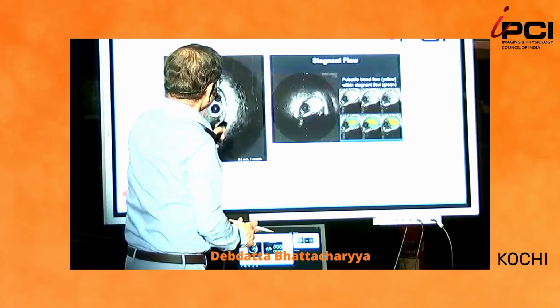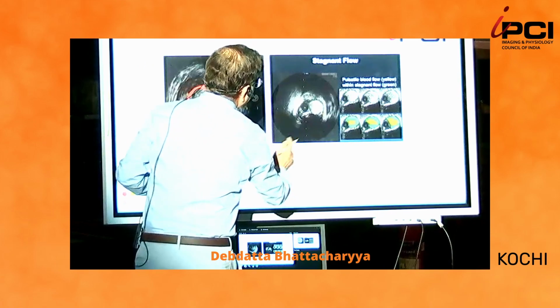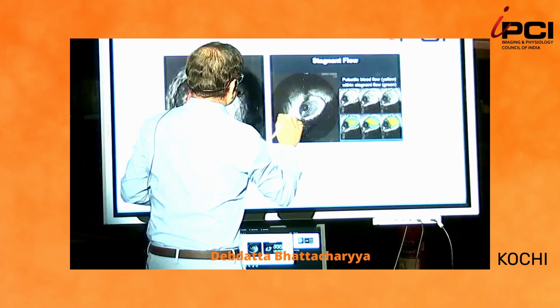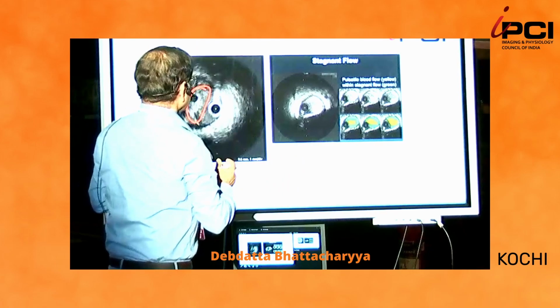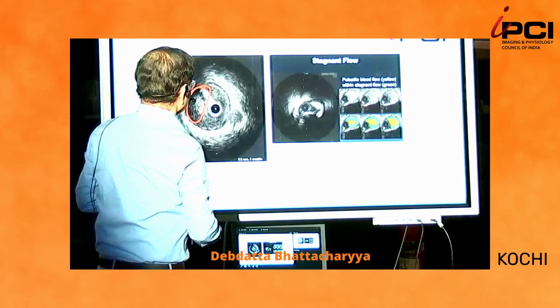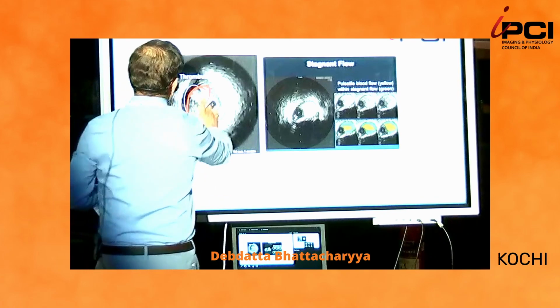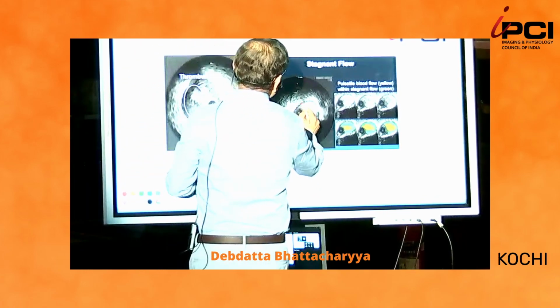Unlike this image, you can see pulsatile flow through this. So if you watch there, you will see pulsatile flow. And it is because the lesion is very tight and the blood distally doesn't clear off easily. So this is thrombus, and this is stagnant flow.